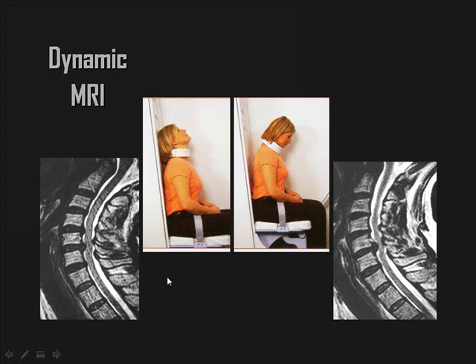Also look for this in the cervical spine. While the patient is in the neutral position, you see only one disc level. But after the patient extends her neck, you got 2 disc lesions. Also, the ligamenta flava are hypertrophied, indenting the cord from its posterior aspect.